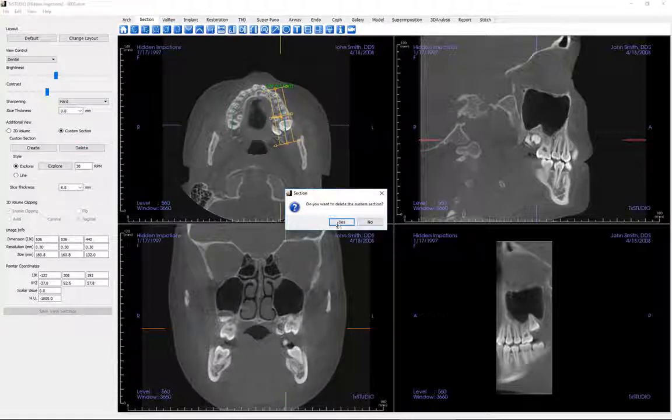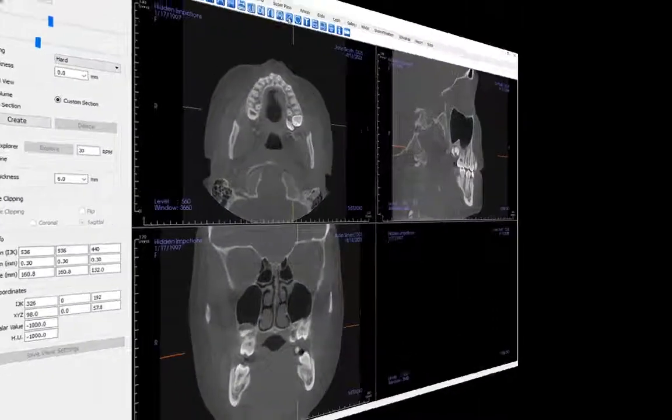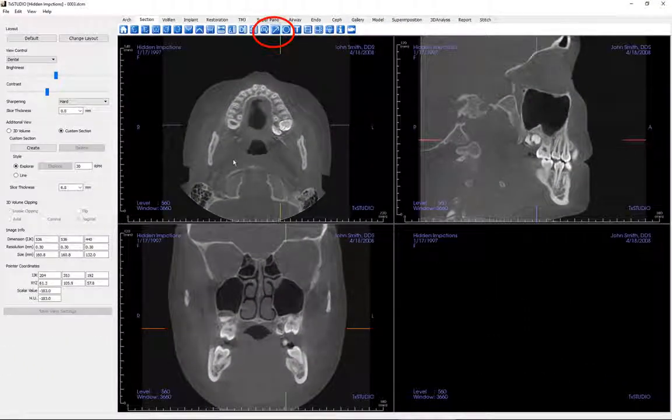The toolbar also provides tools to create screen notation. The arrow notation will allow for an arrow to be drawn on the slice images by clicking a beginning and an ending point. Then, by clicking on the arrow, you may modify its location and/or length by grabbing and dragging the end points. The circle notation tool allows a circle to be drawn on a slice image by clicking 2 points. The circle can be moved by clicking on it and dragging the 2 points.